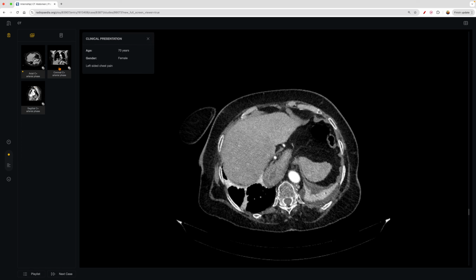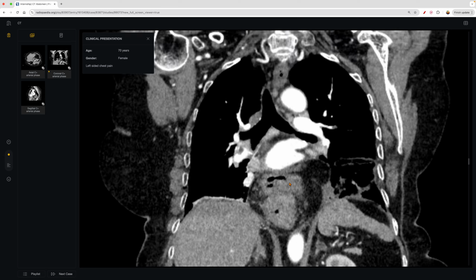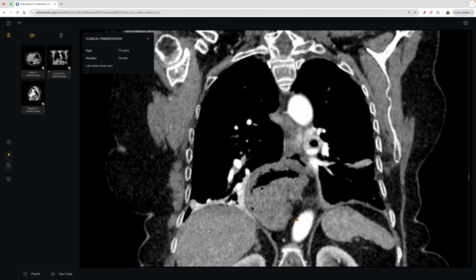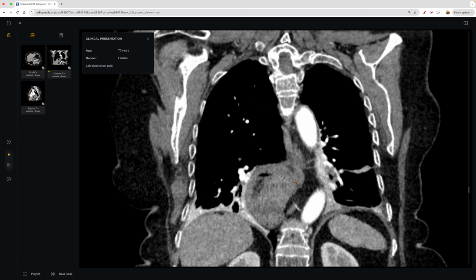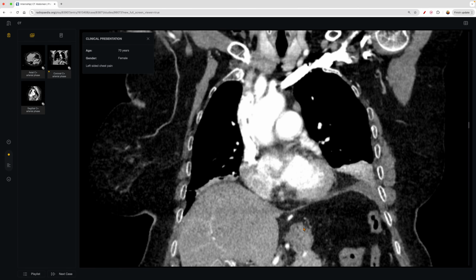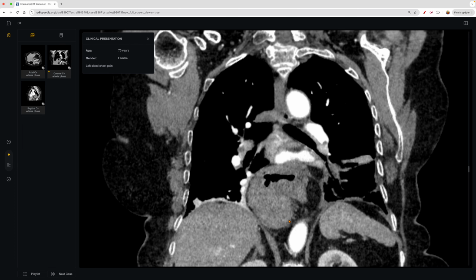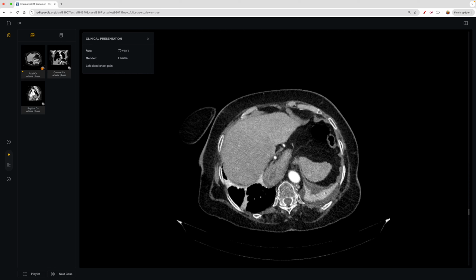All right, so for this patient, again, I like to look at the coronal view. And immediately we can see there's something going on here in the stomach area. There's this giant structure here, right? If you think about, again, how I mentioned the perspectives of viewpoints, you could appreciate that this is a hernia, right? A little bias, or if you're very comfortable, you can easily call that the hernia there.